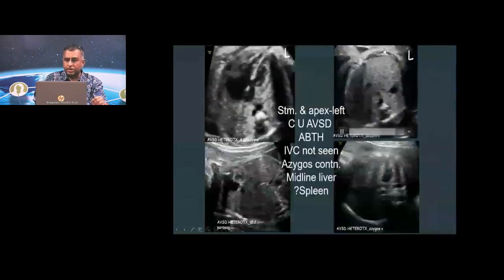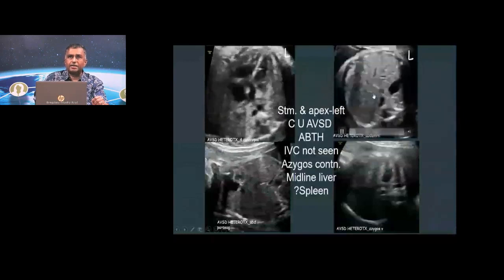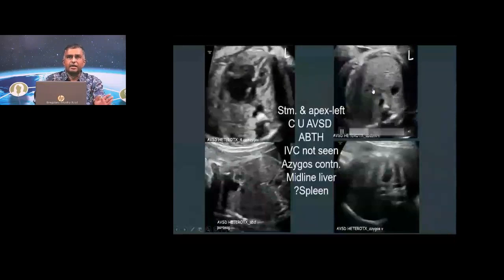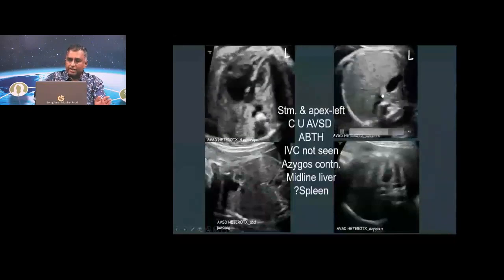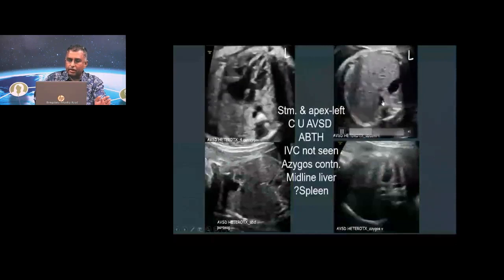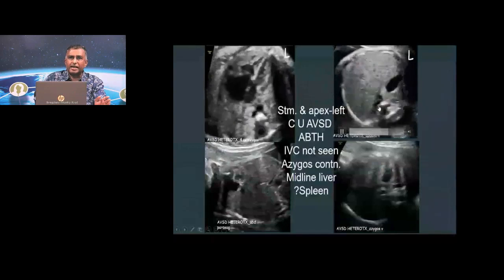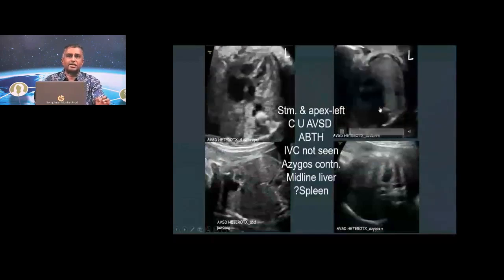It's going from side to side, and most importantly, in my checklist, when I look for the IVC, it is missing, and instead I see two vessels there. That's the descending abdominal aorta that you see here, and to the right of the abdominal aorta there's another tiny vessel. I hope you're able to recognize that, and that is the azygous vein.